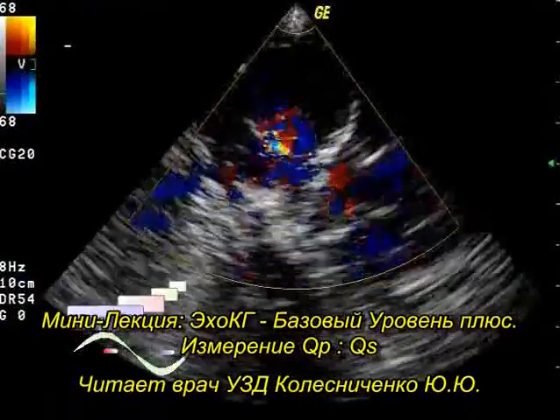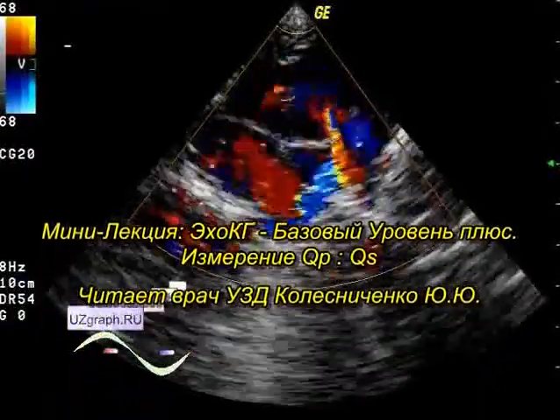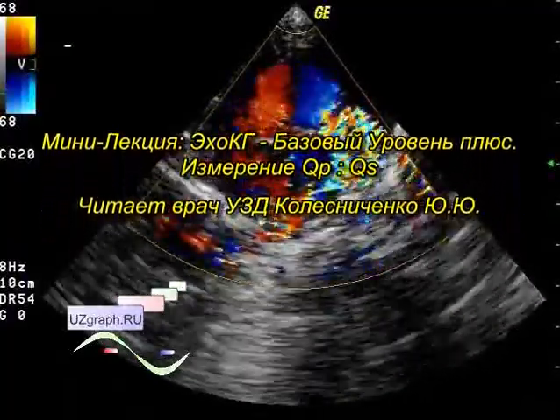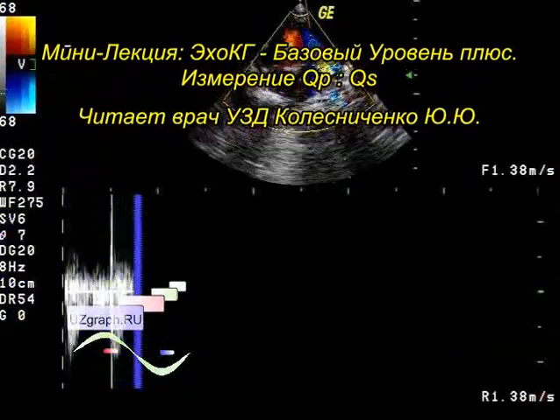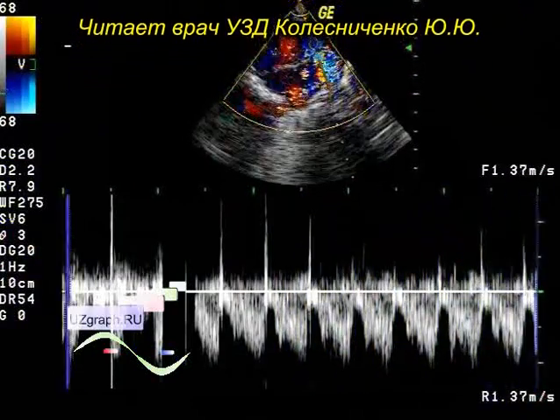I'm a sonologist from Moscow, Russia, and this is a small lecture about measurement of Qp/Qs. Ratio of volumetric pulmonary and systemic blood flows, which is used in assessment of intracardiac shunts.